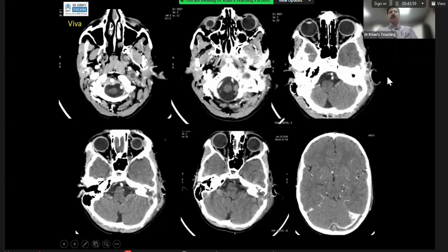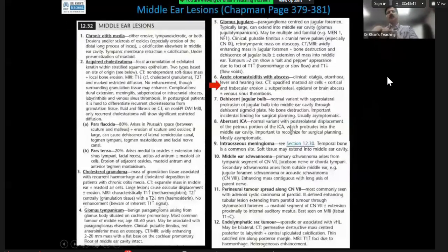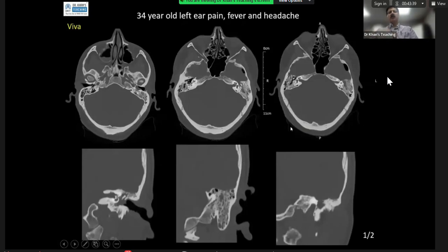This is the jugular vein, and this is the jugular vein, and this is an extension of the same thrombus, which is extending into the jugular vein, in the carotid sheath. So this is just an example of complication. Now, this, on the other hand, is a classical exam case.